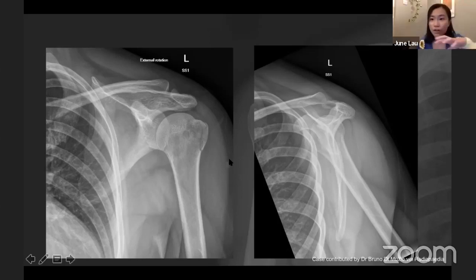It is a fracture of the proximal humerus, so to speak, but humeral head really just means here the articular surface, the smooth bit. This is the greater tuberosity. So whoever said greater tuberosity fracture, well done. So here, if you trace the cortex, you notice there's not so much a step in this case, but definitely a lucent line. And you can see the fracture here.